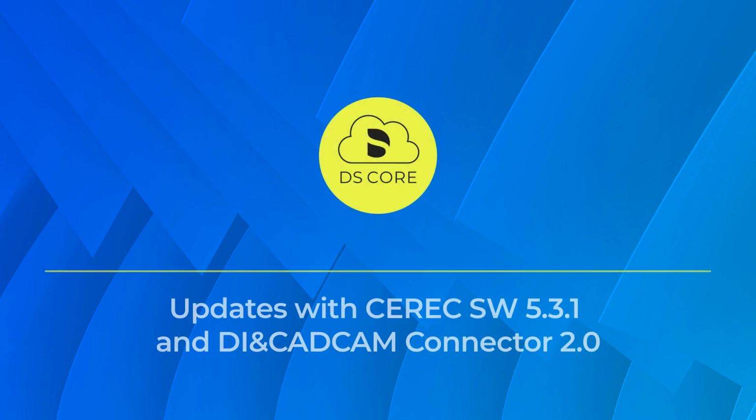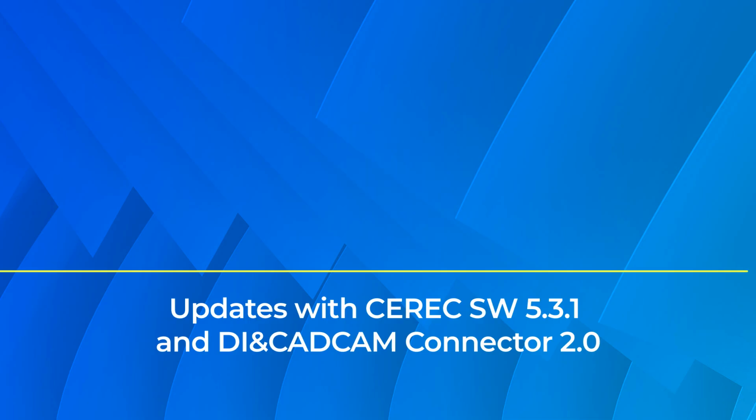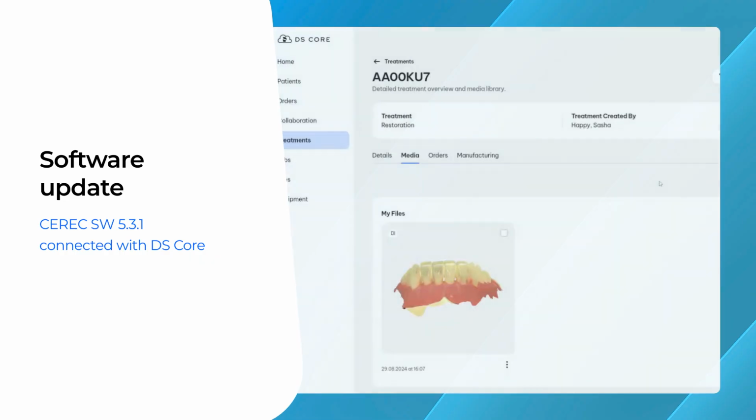The following tutorial explains the improved connectivity between DS Core and CEREC 5.3.1 and PrimeScan 2. Let's begin. This update allows you to open PrimeScan 2 scans directly in CEREC, enabling in-house manufacturing workflows and more.